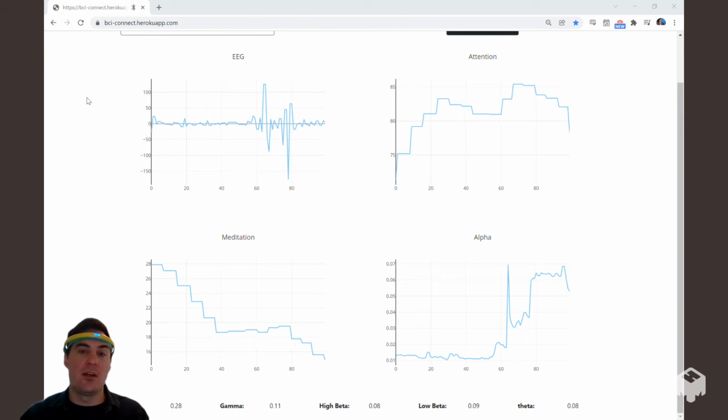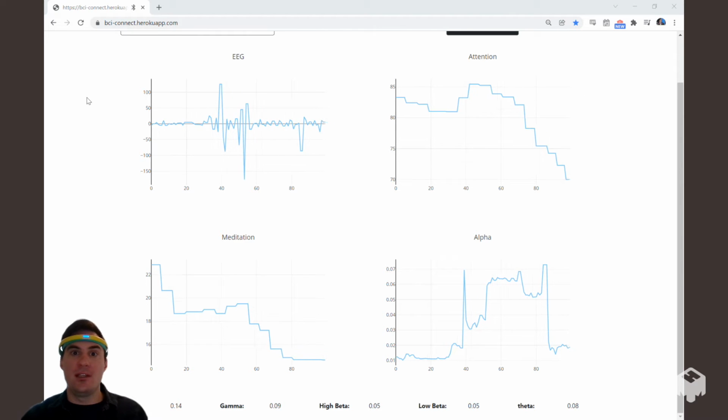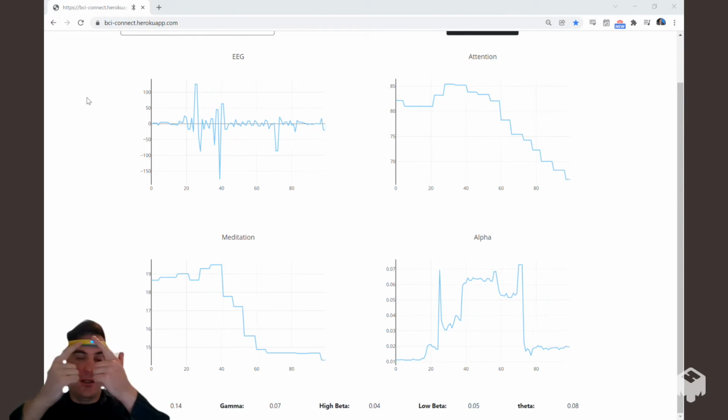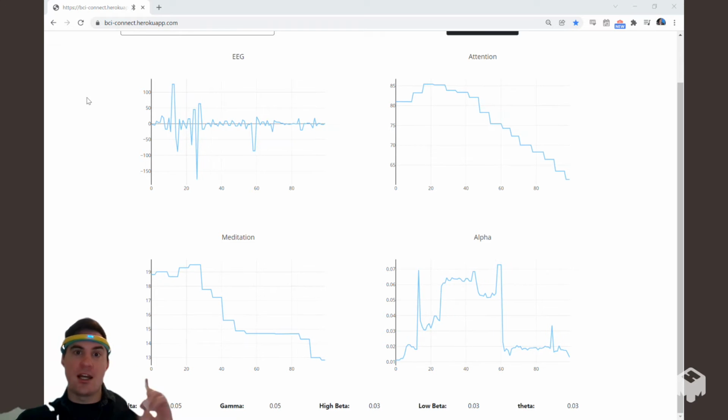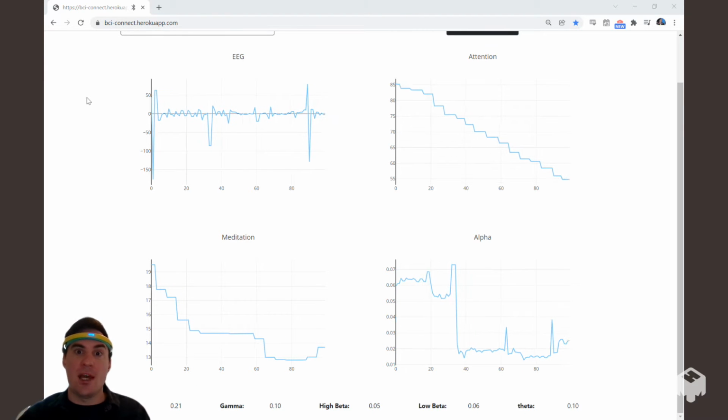So this is NeuroMaker BCI brain-computer interface. You are going to be able to see the things that happen inside of my brain using the NeuroMaker BCI Crimson headband on Chrome. So let's go ahead and take a look at what's happening here.